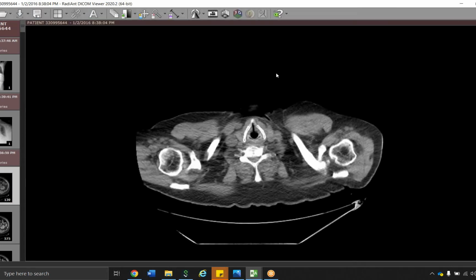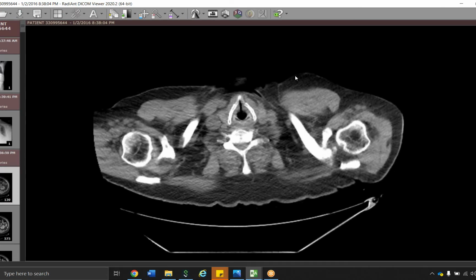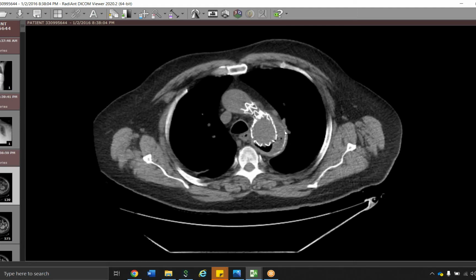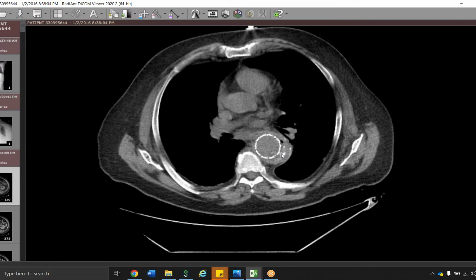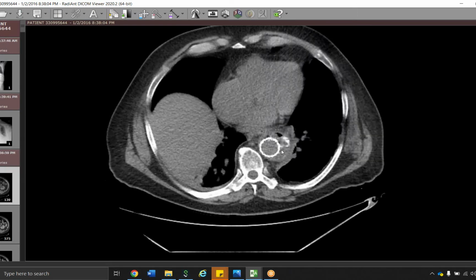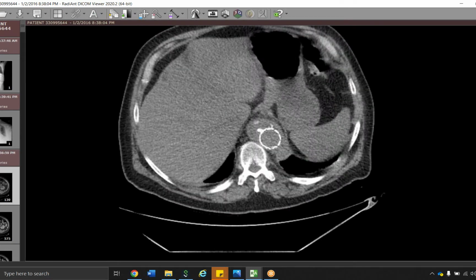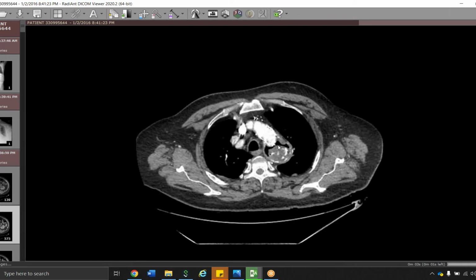So the patient went on to get a CT. And we can see, as I scroll through this, that there is quite a bit of air in the excluded portion of this aneurysm. Going all the way down, there's also some calcifications, those were chronic, but quite a lot of air in that excluded aneurysm sac. Luckily, none of it seems to be within the stented portion, but this was highly concerning for an infection of this excluded aneurysm sac.